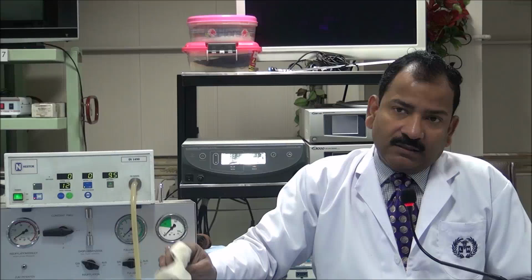Yes. Sometimes we extract the air in the beginning of the operation and we didn't reset the machine. So that is a technical problem. Yes, that way you are correct. But then also the minimum of the pressure will not be 6. Isn't it? Now next question. And there would be other signs and symptoms as well. Pardon? May lead to air embolism.